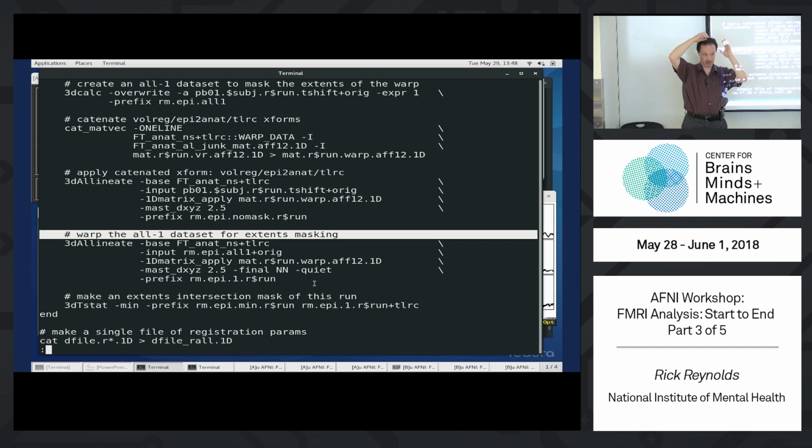And what happens at the edges is over time, sometimes you have data here, sometimes you don't. When the subject moves down, the part from outside their brain is coming in there. You don't have data. They move up. So that motion actually means at the edges of the brain, you don't always have actual data. Forget whether or not you're in the brain, data at all. The EPI box is solid, but the subject's moving around, and then we rotate the box according to the subject, and therefore at the edges, you may be rotating non-existent locations into your data, which will be 0. Having zeros isn't necessarily the problem, but you have zeros and then suddenly data and then suddenly zeros, and so you can get weird artifacts at the edges due to that.